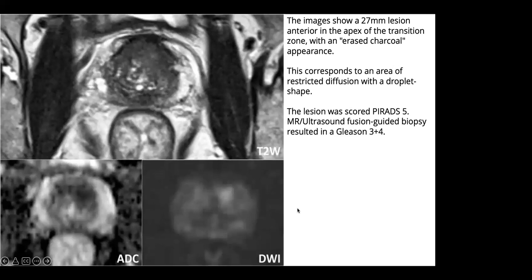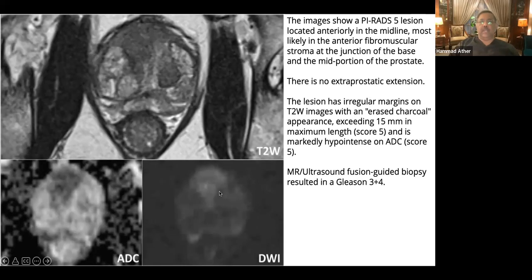Yes, Dr. Amar. Right. So again, I think very clearly defined. And in every image and in every slide, we are introducing some new concepts for you to take home. So the 15 mm cutoff is important. The shape of the lesion is important. The representation of these lesions in the T2 weighted, ADC and DWI sequences is important, and they have to be represented in each sequence in order to define it as cancer.